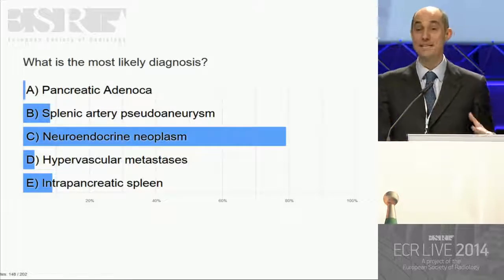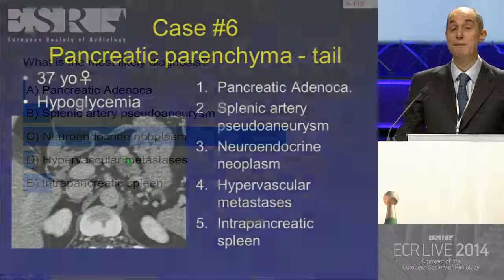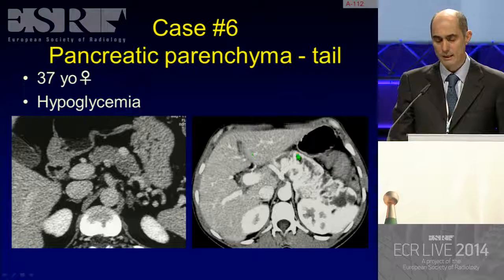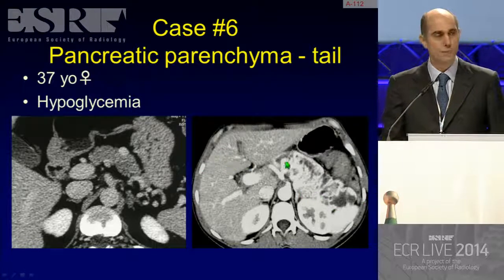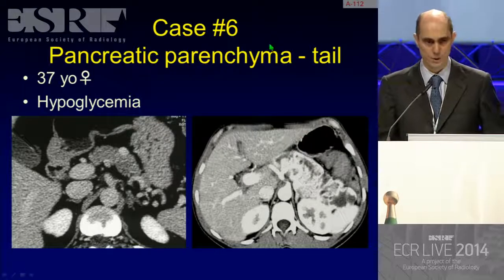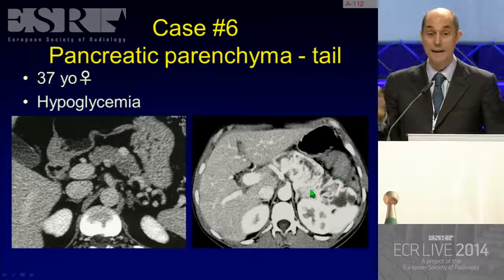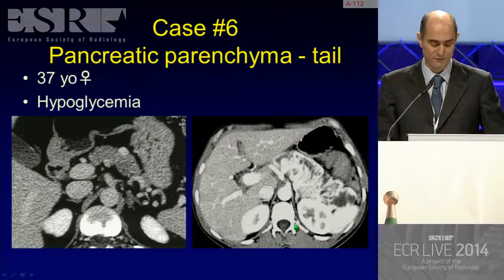And this is, in fact, a neuroendocrine tumor, which may be focal, like in this case, but rarely neuroendocrine tumor may also be multifocal, like in this other patient that I'm showing you here, in which she underwent total pancreatectomy because the pancreas was full of neuroendocrine tumor. This patient was operated in 2006 by Professor Bassi from our institution, and she came back last week, and she's perfectly fine, in good health, and obviously we are happy for that.